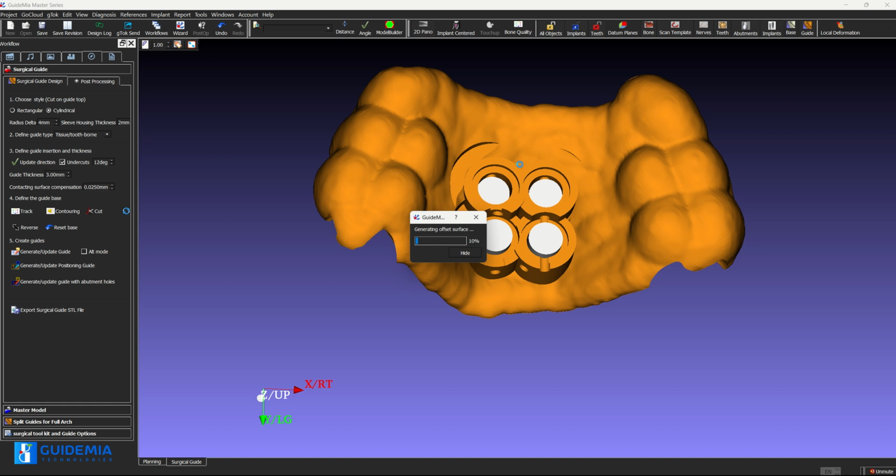One thing I want you to notice, you see this slot. That's I purposely create one when I was doing the planning. In general, some of the manufacturers want to have glues. Those slots are for injecting the glues.